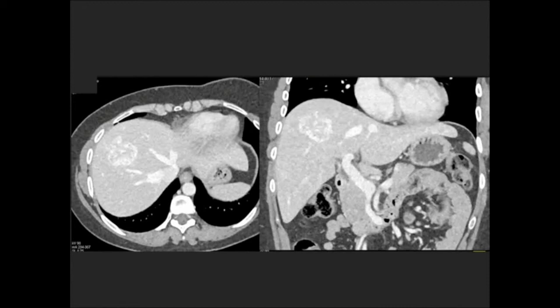FNH, the density is fine, though FNH is usually more homogeneous, often with a central scar. Hepatic adenoma is a good thought. Vascular lesions which have variable enhancement, that is indeed a possibility. But the truth is all three of them are indeed possible.